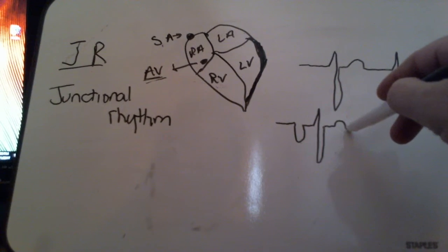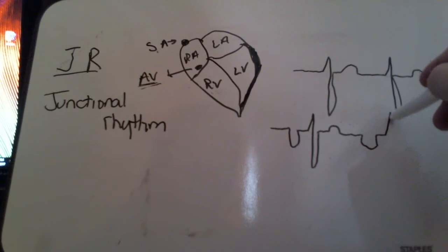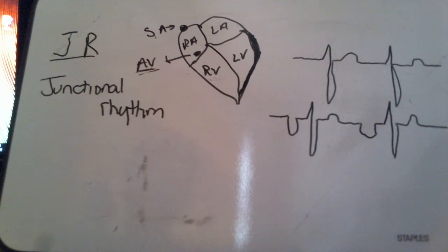And again, your T wave is positive, but there is a retrograde P wave or negative P wave. So it can look either way.